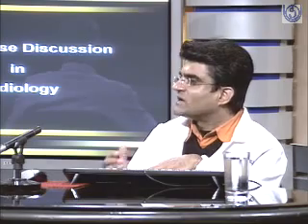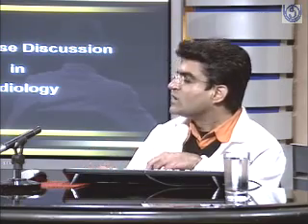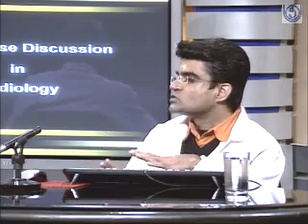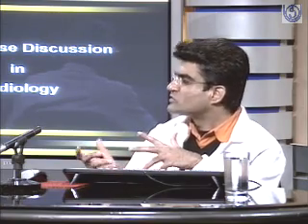So you can also tell about the lung entity, whether the patient has aspirated the food material. You will find a pneumonitis picture, a consolidation. So you can get ancillary findings also with respect to your main focus of interest, that is barium swallow. Like you can see the lungs, there may be consolidation.